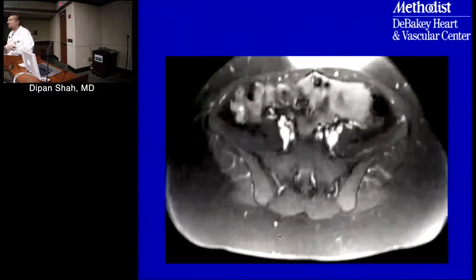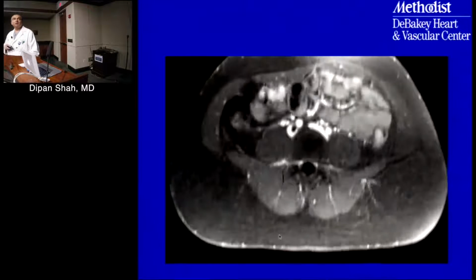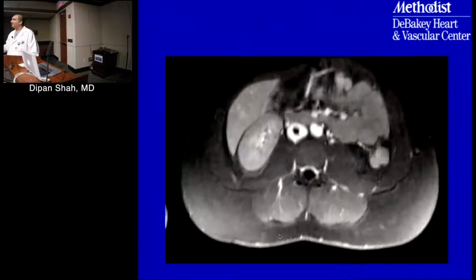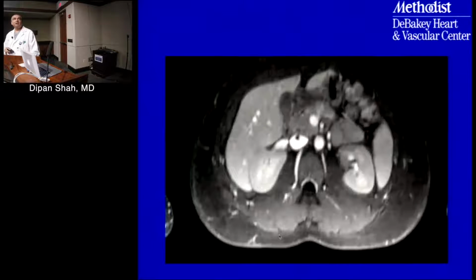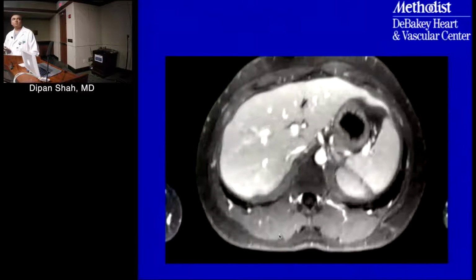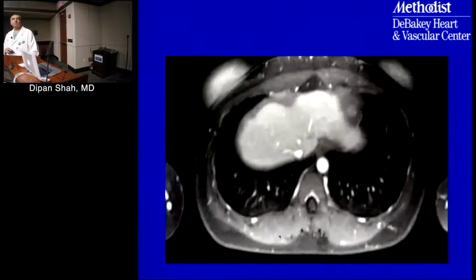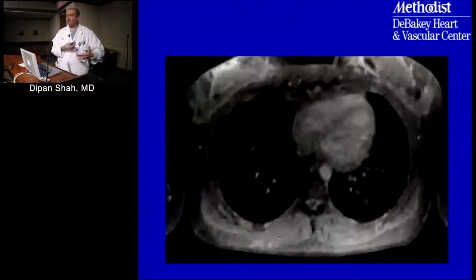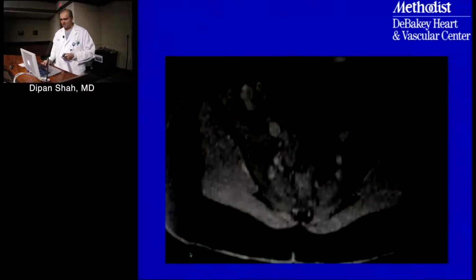And so this is typically done about 10 minutes after the administration of a contrast agent, and this can be done with regular gadolinium, or we can use blood pool agents like Ablavar, which basically are bound to protein, so they bind to albumin, so they actually stay within the blood system longer. And so at the end of each vascular study, we always will do this equilibrium phase imaging. So it's important that you always get first pass imaging, which is the angiogram, and then you always get a late phase or equilibrium phase image. And then this is typically done in a straight axial orientation with a series of axial slices through the area of interest.